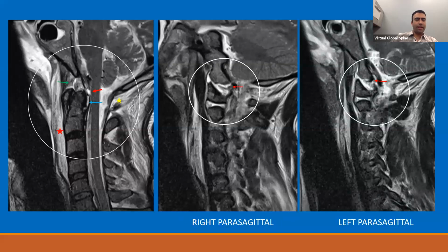You see there's gross instability. It's very, very obvious on the CT scan, and you're just confirming it with the MRI. You can see there's a pretty significant ligamentous injury at C1-2 and C2-3. This is all pretty much a pure distraction type injury. In these kinds of cases, there's really not much room for medical management, because it's the nature of this type of injury that it's so unstable. The surgery itself is really an occipital cervical fusion, or external bracing in select patients, meaning a halo.